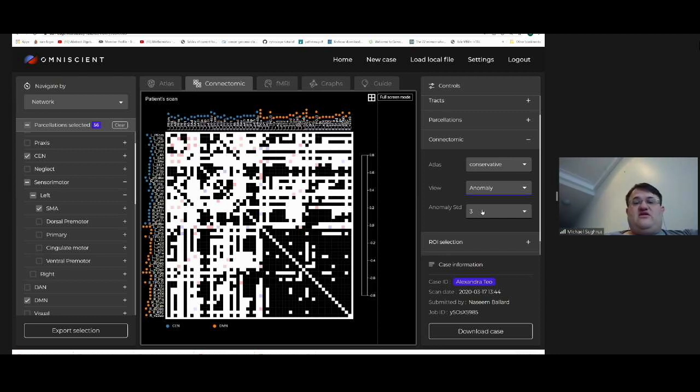So as you can see here, this is a tool that we've created, and this is generated in the folder as well, where we created a training set of about, and Stephane can correct me, but I believe it's about 300 normal individuals from different data sets on different scanners. And we determined what the standard range of correlations for these normal, or at least people without disease, was for all the correlations we perform, which is I think about 143,000 tests. And what this will give is an output of one of four things.